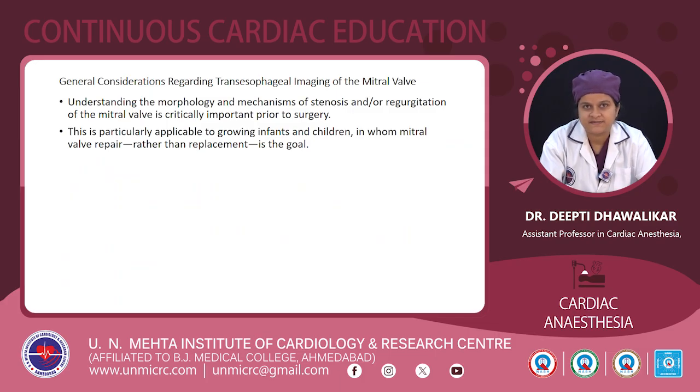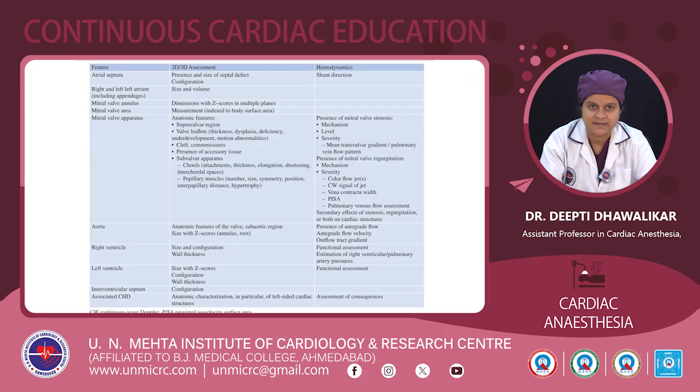So, general considerations regarding transesophageal imaging of the mitral valve. Understanding the morphology and mechanisms of stenosis or regurgitation of the mitral valve is critically important prior to surgery. This is particularly applicable to growing infants and children in whom mitral valve repair rather than replacement is the goal.